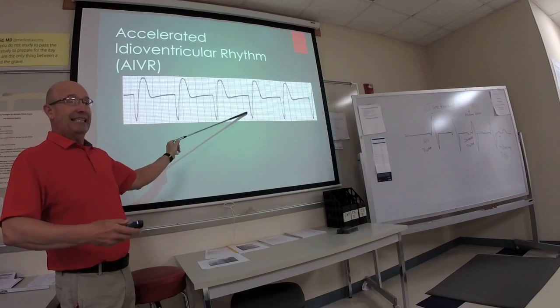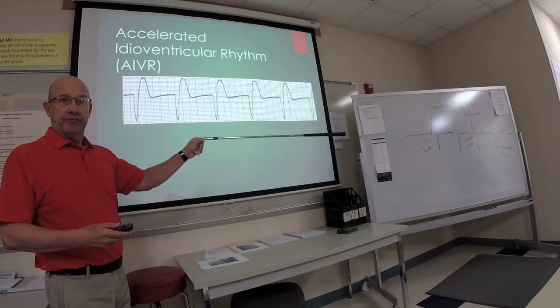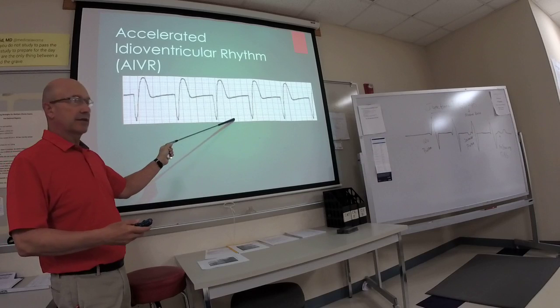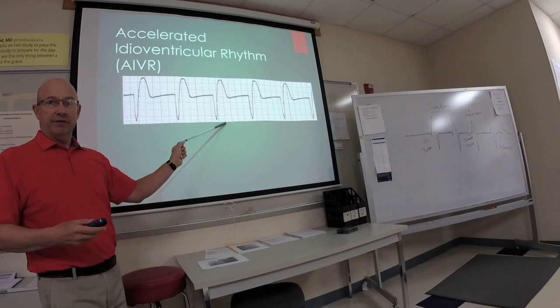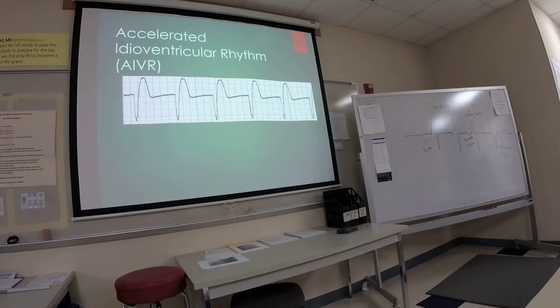There could be a pulse with that, okay? But again, it's down to the last ditch effort for the heart to contract. This person's going to the cath lab. They're going to have to figure out why they have that idioventricular rhythm if they still have a pulse. They may not have a pulse with that either.